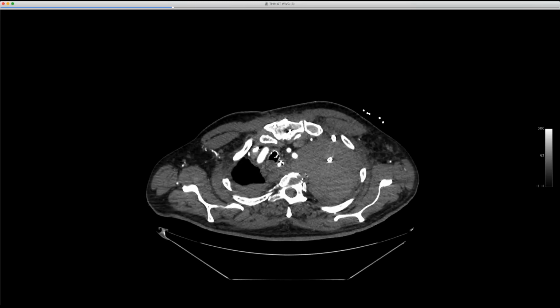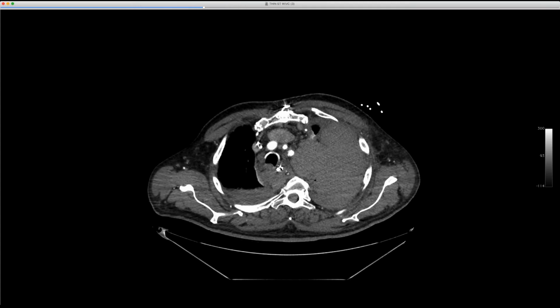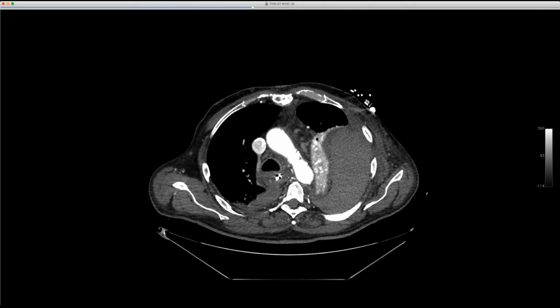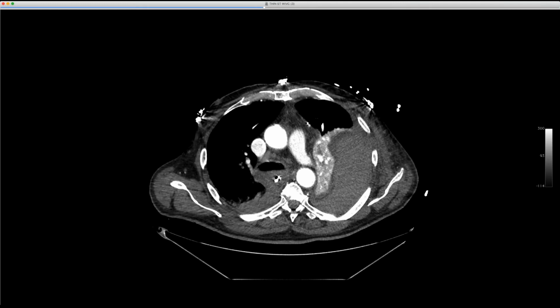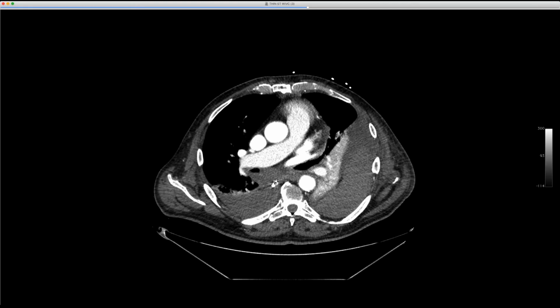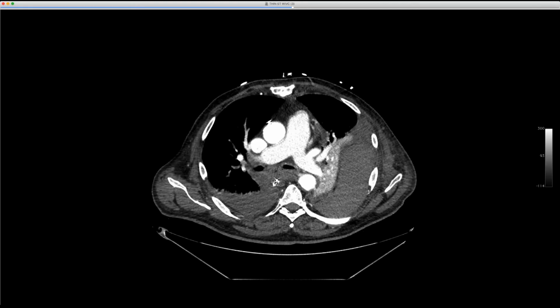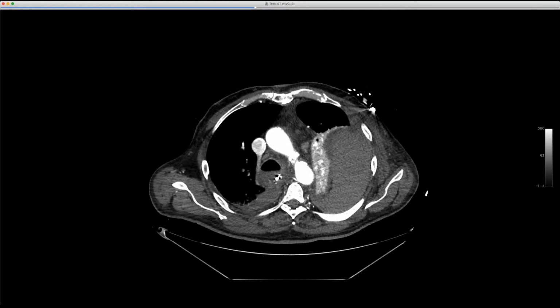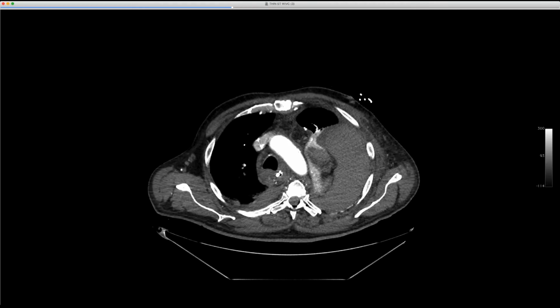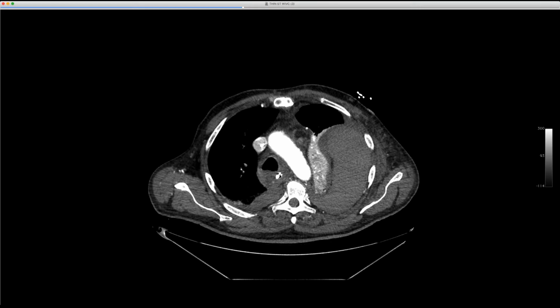So we kind of surmise that he's auto-tamponading, and maybe that's what's going on with this mediastinum as well, that he managed to tamponade some of the, contain his rupture with a bunch of blood. Now, it must have been a small tear or something, because I would expect to see more gas even without this tamponade effect. But I thought this was just a really impressive extrapleural hematoma, probably coming from his subclavian. And I think that was the final radiograph on him.